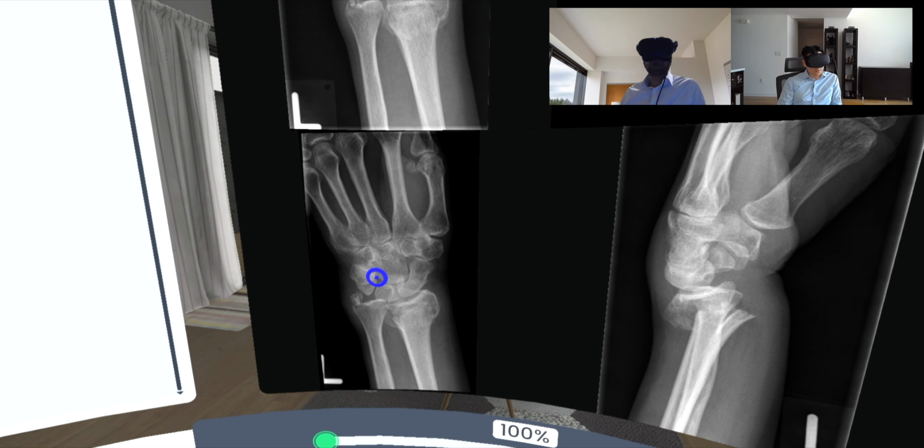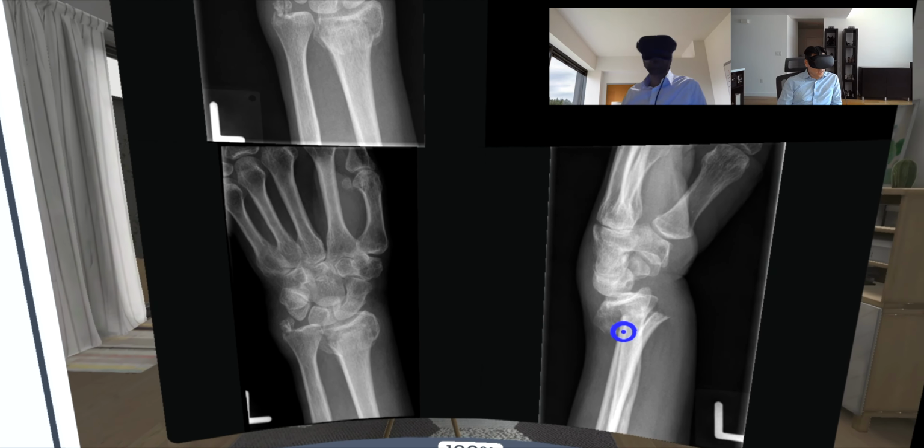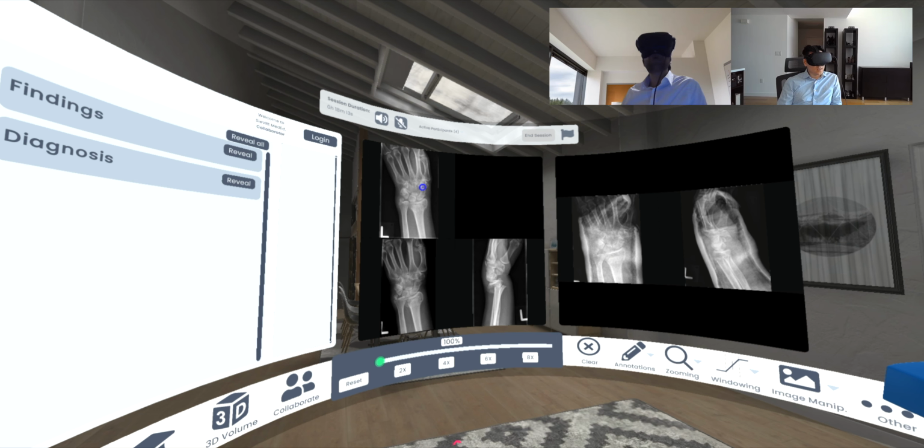This is called a Colles fracture, whenever you see a distal radial fracture with dorsal angulation of the distal fracture fragment with impaction. You can commonly see the ulnar styloid being fractured, but the carpal bones could be fractured as well. So you definitely want to look for any disruption of the carpal bones here, which I don't really see.